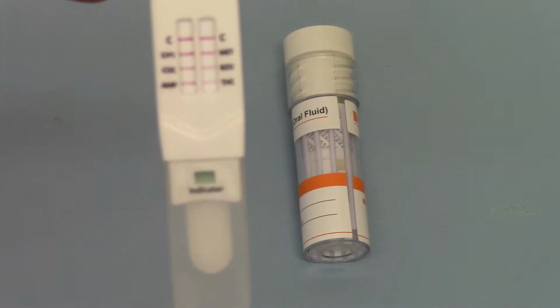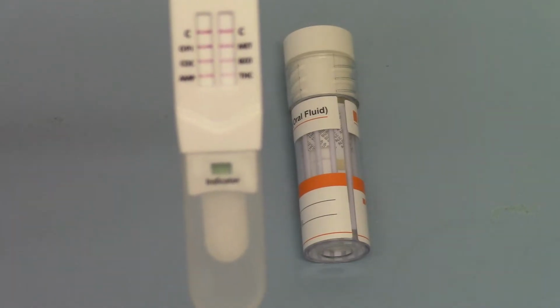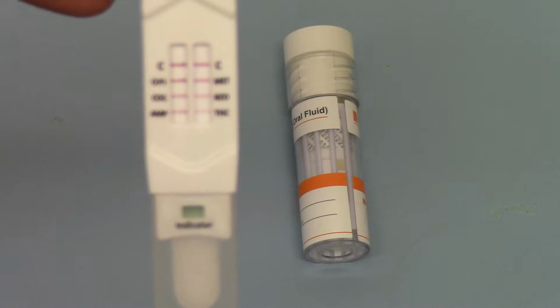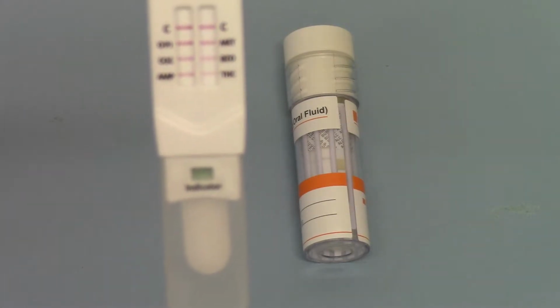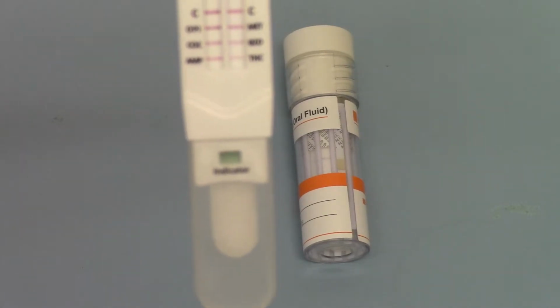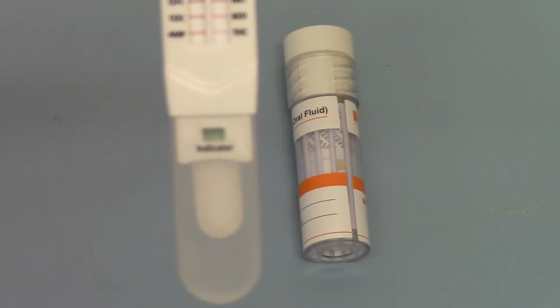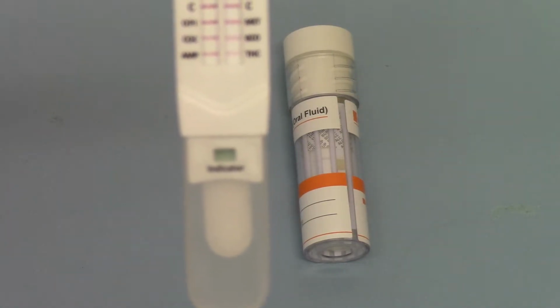But why do you get this variation in the colour density? You'll see the control lines, there's a little variation in the two colour densities between the two sides, but the THC line is extremely faint. Now the reason for this is these are all individually embedded membranes that have the antigenic material embedded into the membrane, and these are built up in a strip, if you like, along a long flat piece of membrane which is then cut into these strips.